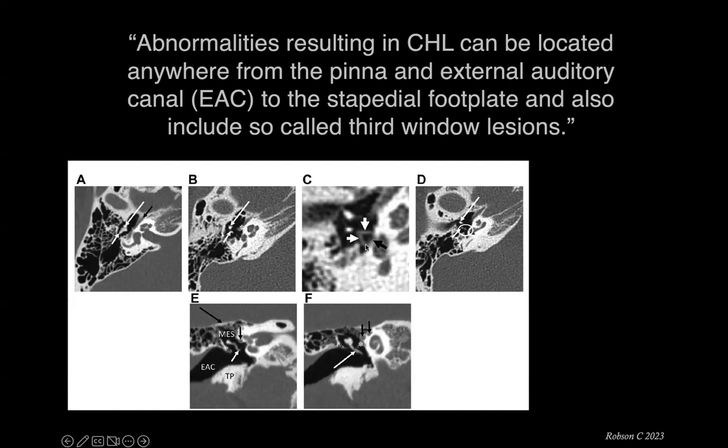We may need specific reformats to see the stapes, and most importantly, guys, remember, you need to see the oval window, and you can follow here the bone in the otic capsule that is interrupted here because this is the region of the oval window. And if you see bone all the way, you cannot identify this soft tissue window, you may be dealing with oval window atresia that you need to diagnose.